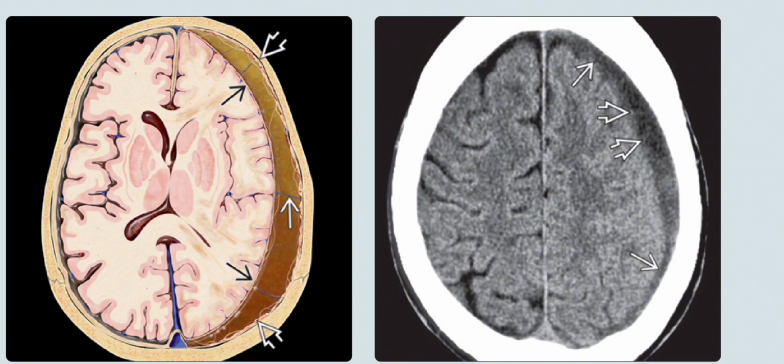Chronic subdural hematomas. The left image is the axial graphic, which depicts the pathology of classic chronic subdural hematoma, with the formation of thin internal and thicker external membranes. Also noted are the stretched bridging veins, which are seen crossing the subdural hematoma, and top to bottom gradation of the fluid from the serosanguinous to the more proteinaceous contents.